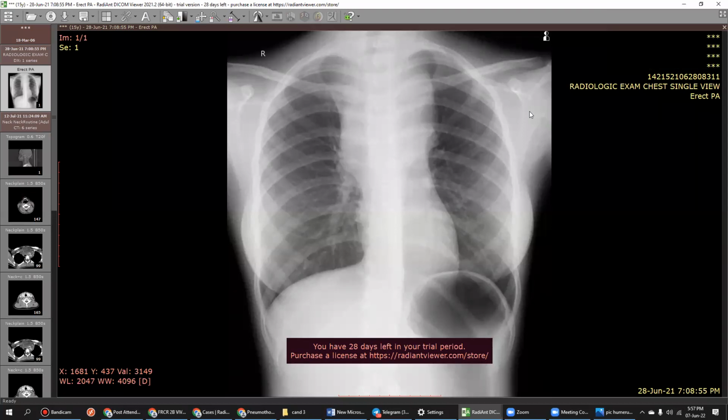Time is over. Where is the arch of the aorta? Time is over or 20 minutes is over? I think 20 minutes, right? Yes. Where is the arch of the aorta? I'm not able to appreciate it. Yes, it is silhouetting the arch of the aorta, so it could be posterior. It's involving multiple compartments. Likely lymphoma is possible in that case, which involves multiple compartments. Did you see the age? No, 15-year-old. So tell me the differentials.